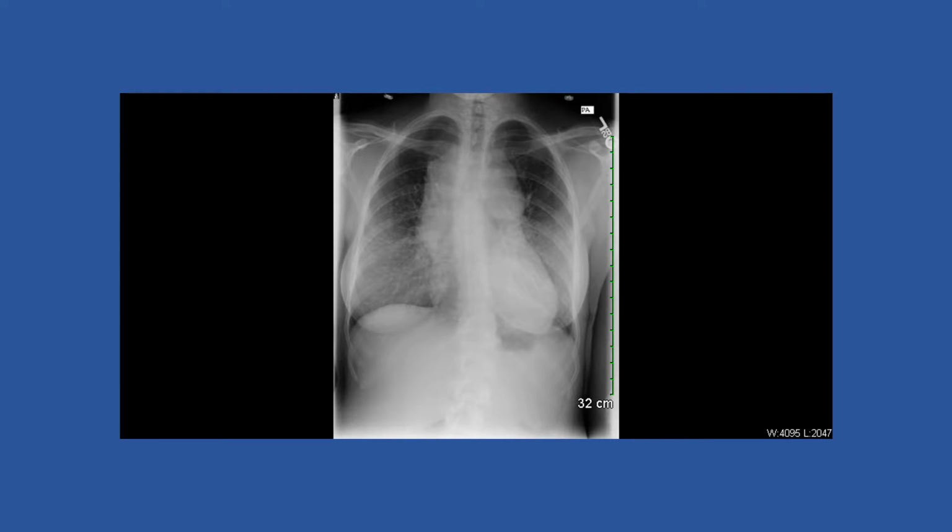So if we look at the chest, we take a strategic approach to it. We see that the gutters are actually pretty good. There's no blunting here. We follow it around. We see that there's markings in every area, so there's no sign of a pneumothorax. We do, however, see that there is pretty substantial widening of the mediastinum here.